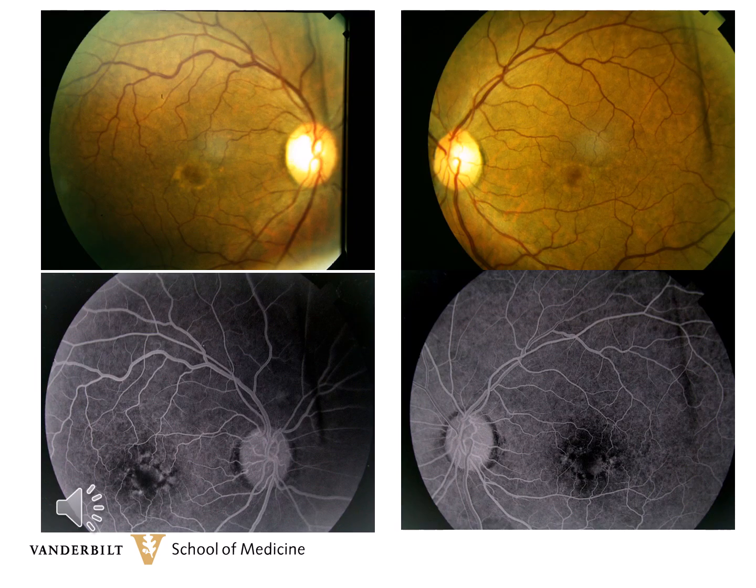Now I have this gentleman in my pattern dystrophy folder on my computer, although I could see arguments for age-related macular degeneration, because that diagnosis could be in the running as well. Unfortunately, there's no OCT to make an absolute definitive diagnosis. The angiogram, though, is typical of other patients whom I have seen who do have pattern dystrophy.